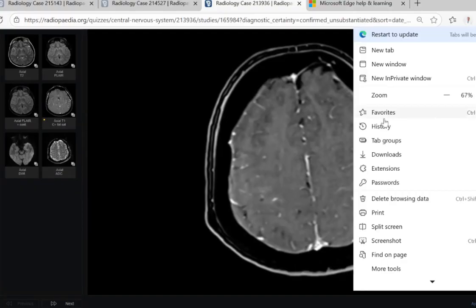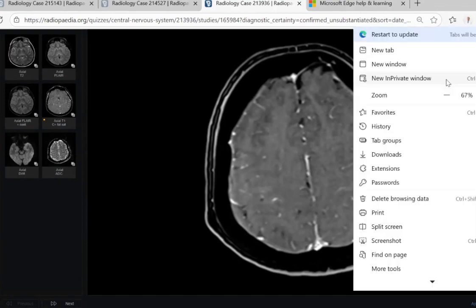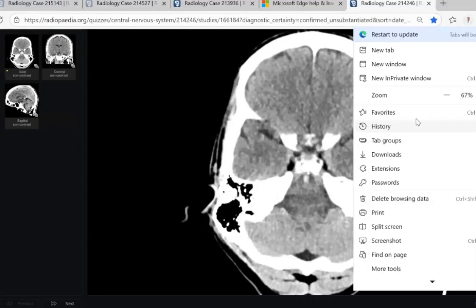Number one, the injury of the brachial plexus itself and the replacing of the nerve tract by either meningocele or fluid. This is the main pathology. Yeah, I thought it's edema in the muscle, or even blood, because it's high in T1 and it's not suppressed in the STIR.